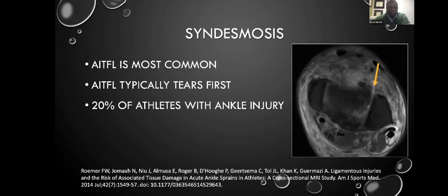And so then the thing you're looking for, remember I said with ultrasound and MRI. One of the things to remember when you're learning is that it's all the same. The anatomy of ultrasound is the same as it was for MRI. So if you're following fluid in order to identify a defect in a tendon or ligament or whatever structure, the same fluid that you're going to identify going from one compartment to the other on ultrasound or on MRI is going to be the same thing you look for on both.